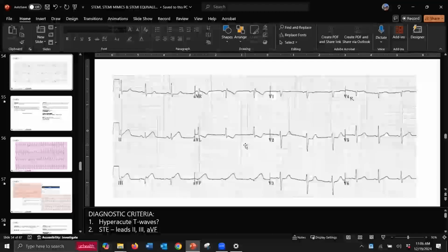It does illustrate a very important point in EKG interpretation, and more importantly, in ST segment interpretation. Where do we truly measure ST segment elevation and depression? The J point. No, interesting. That's my training. That was mine too. So where? 0.08 seconds past the J point. That's where your monitor measures it, the ST-J, like in physio: it's measuring at 0.08 seconds past the J point.